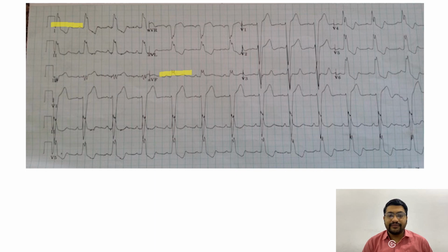All right. So if I start looking at V1, I will see a S wave. Our QRS complexes from the start of R wave to the end of S wave is almost 3 small blocks or more than 3 small blocks. So we have our broad QRS complexes, our ST segment is elevated and T wave is positive. But in the case of V6, we see a slurred R wave making a M pattern. All right, we discussed in Willem that M pattern in V6 is that of left bundle branch block, and our ST segment is depressed and our T wave is inverted.